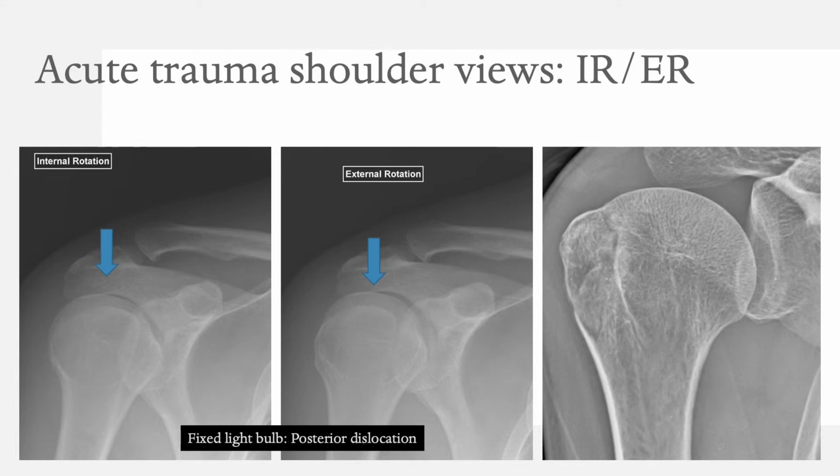Another very common injury that's very easily missed, and probably the most commonly missed injury, is the non-displaced greater tuberosity fracture, and that you can see very subtly over here. Now it's very important that you look for these fractures in external rotation, because in internal rotation that greater tuberosity is facing you and is overlapped by the rest of the humeral head, and therefore you cannot tell this fracture. So it's very important to look at externally rotated views, especially when you're concerned about a greater tuberosity fracture.